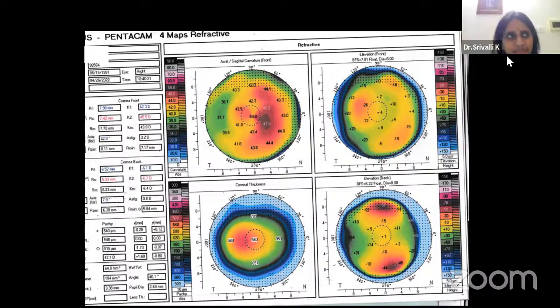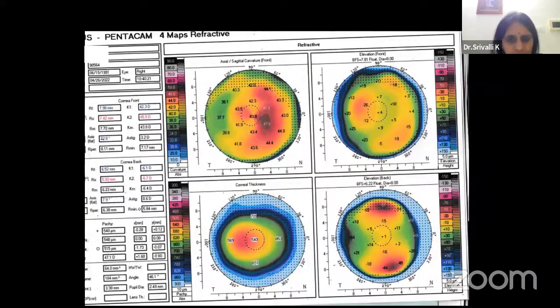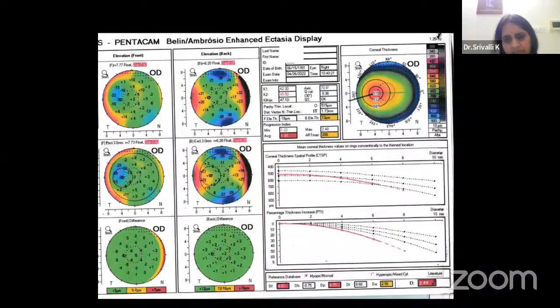That's a totally different class altogether, an unhappy refractive surgery patient. Yeah. Okay. So see, when you look at the other eye, this becomes clear. If you just look at first this eye, it's a little confusing, right? Yes, ma'am. Good case.